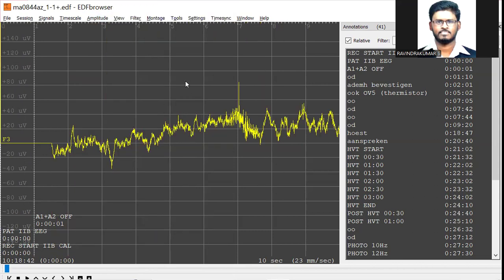So we can see the event potential signal of the EEG waveform, which represents the different functions. Each electrode recorded from the human scalp will have its own information. The information will be a collective information of different functions performed by the brain for different activities. For example, if you want to analyze the muscle functions or the movement of the skeletal system, the electrode corresponding to the motor functions has to be visualized.